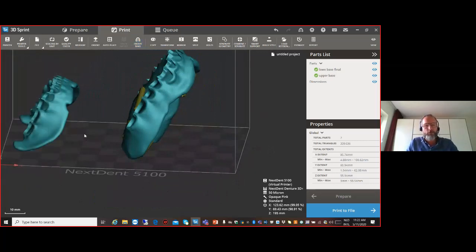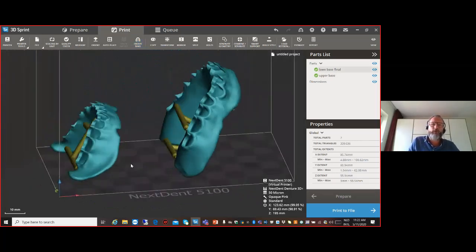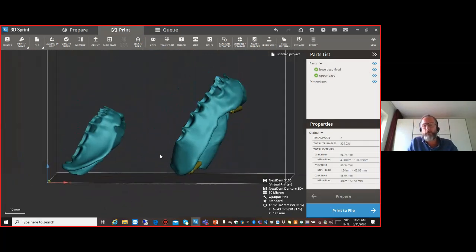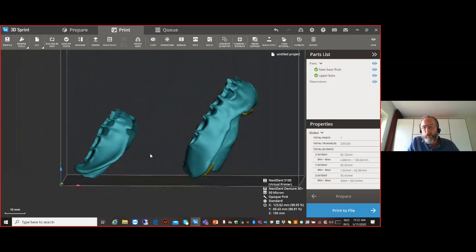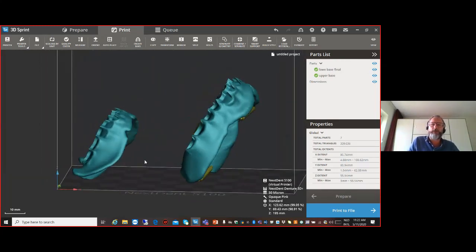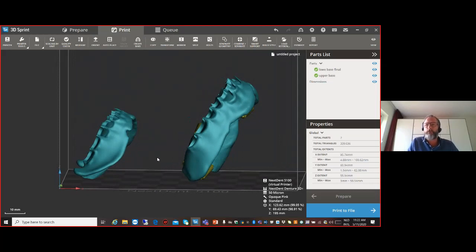So we've placed all the supports, which is now very easy with the create bars option. It's just a matter of seconds. If I do this, let's say, away from this webinar, it's just click, click, click. When you know where to place it, it will take you not more than a minute, I would say.